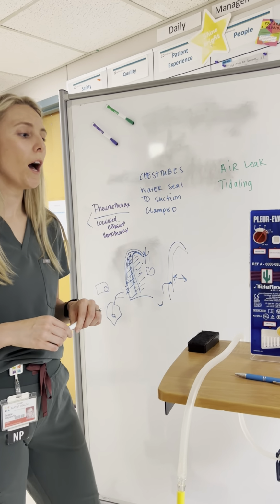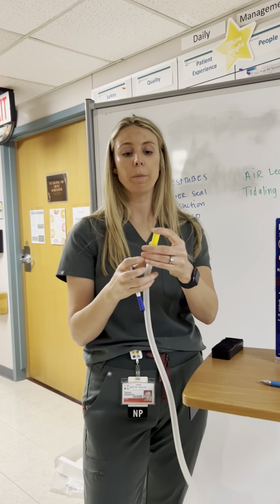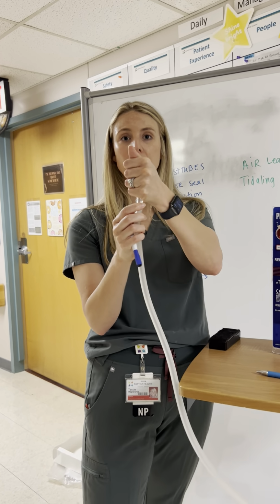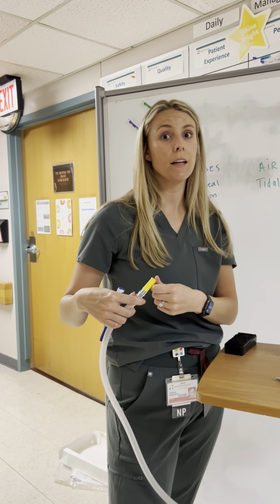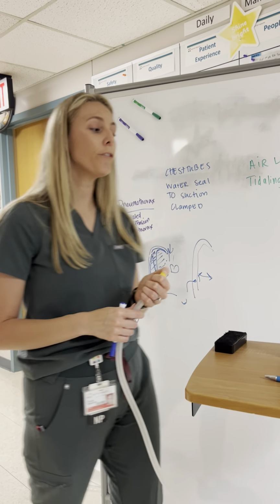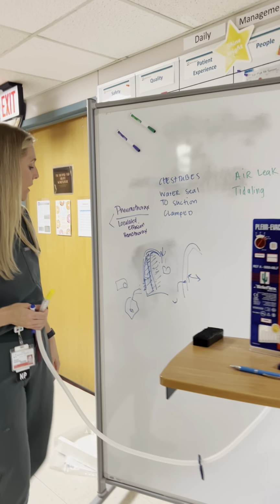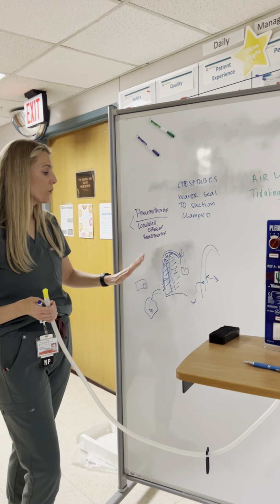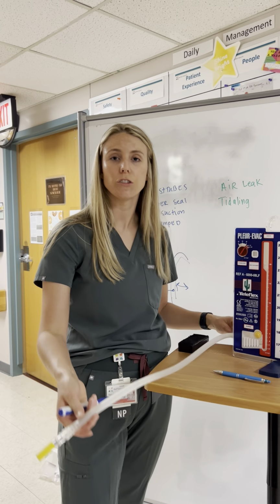So really important with patients who have pneumothorax, increased risk of tension if they're on positive pressure, that you always make sure that your pleurovac is not kinked or occluded. Typically the 14 French chest tubes that get hooked here really easy can get clamped and bent over and occluded. If you're not getting suction to your pleurovac, not seeing the air leak, not seeing the orange thing there, then you could very easily develop a pneumothorax under tension despite having a chest tube.